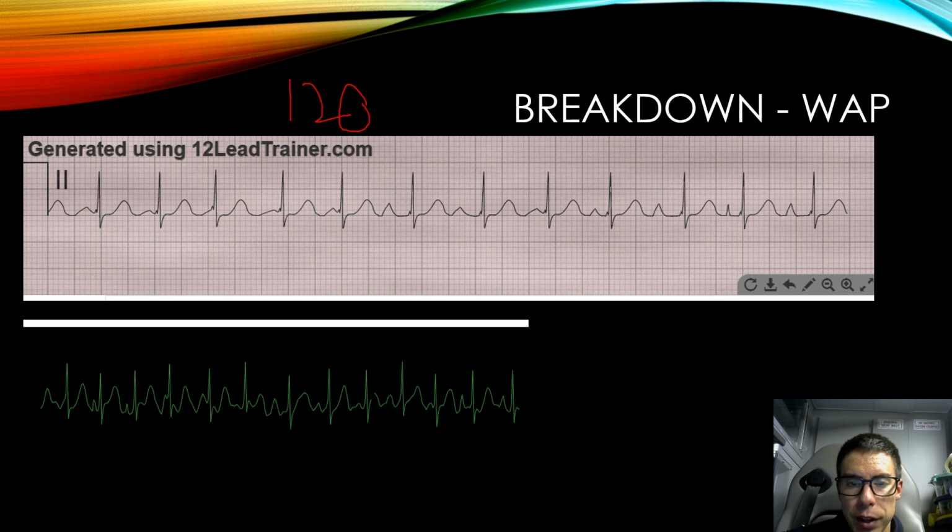That's probably the very beginning of a P wave, and then the QRS comes and drowns it out, so you don't see it. So in this one, it does look like there is a P wave for every QRS, although it's hard to see, but there are no extra ones, which is a big part of that. So yes, P waves are present, no extra or missing ones from what we can tell. Are these sinus P waves? No, they're not monomorphic.